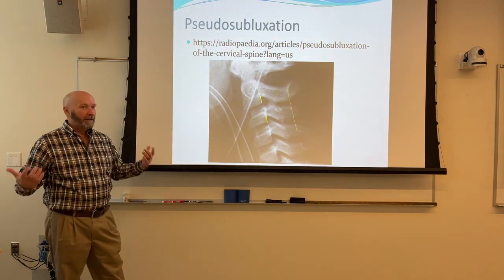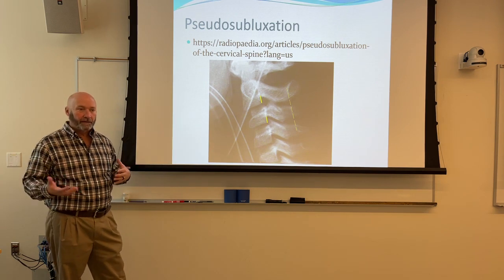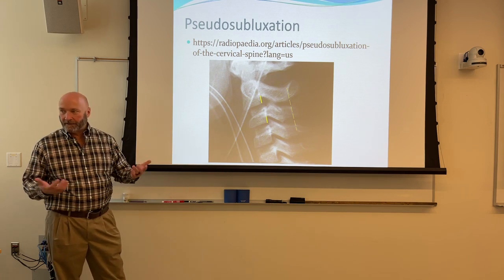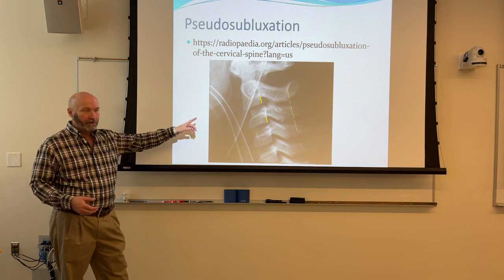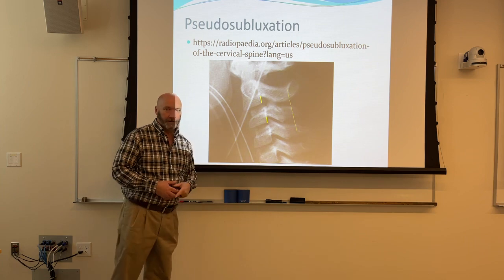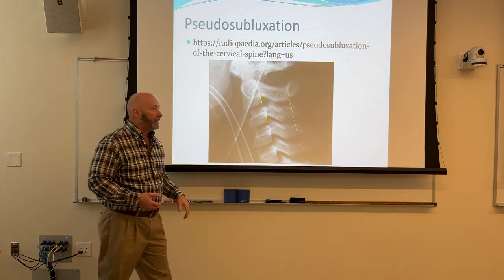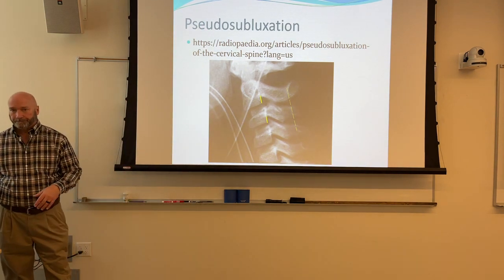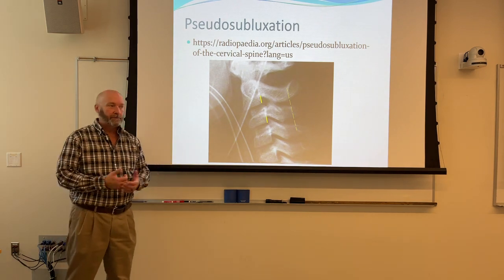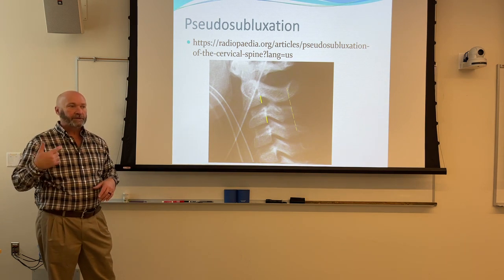As the baby develops, as the kid develops, eventually they're going to outgrow that, and the rest of the vertebrae are going to catch up to it. But when they're that young, there's a very good likelihood that they've got pseudosubluxation. So what we may be called to do sometimes is to rule that out and look for that posterior alignment, once the ER doc has cleared the kid. So we've done laterals, AP, he's done his clinical assessment, whatnot. They might ask us to get the patient up and do flexion extension views.